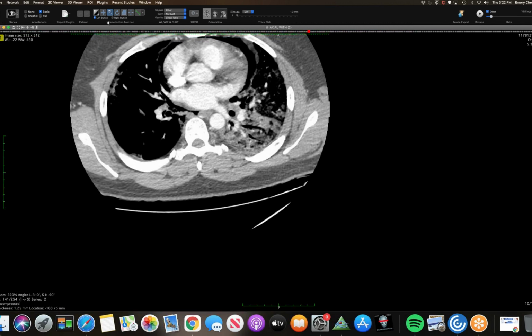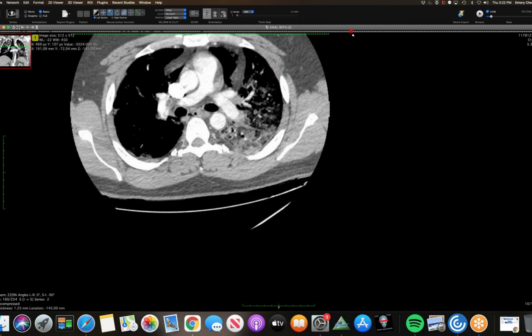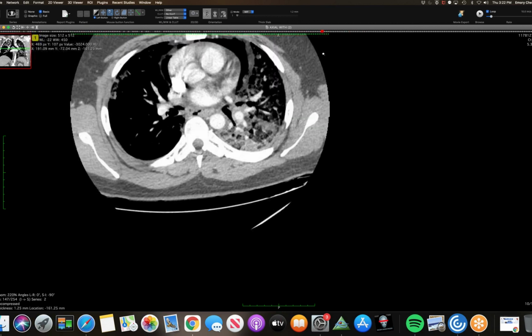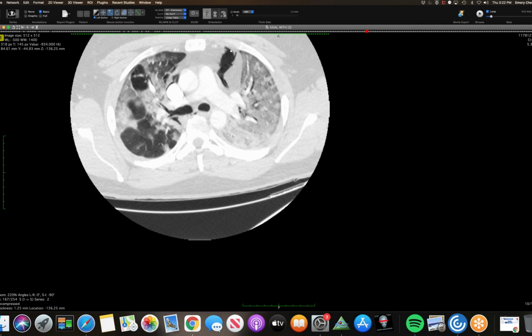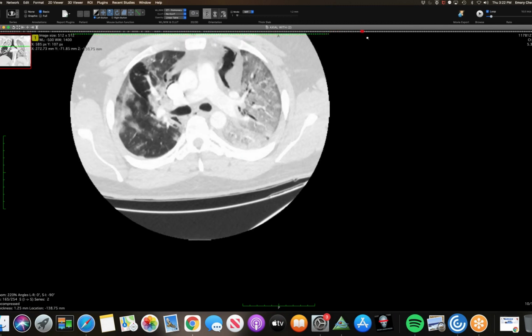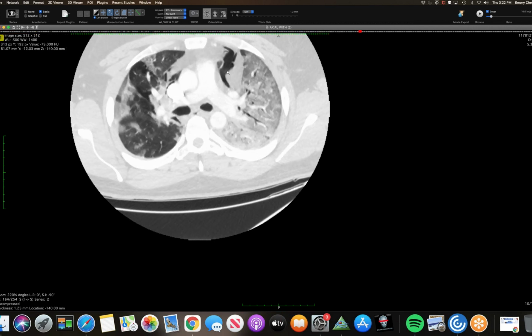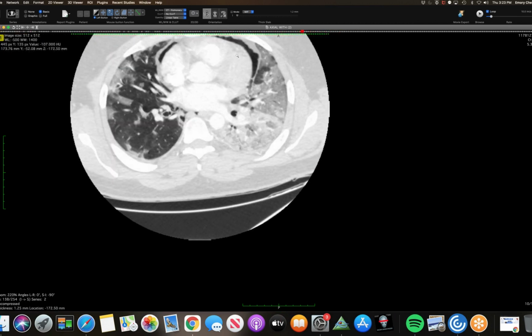And so all it has to do is track up those pulmonary veins, and it can go all the way back into the pericardium. Yeah, but this doesn't really make sense then, right? This lucency here is going anterior? Yeah, so it's beyond the pericardium, but there is a pneumopericardium component. And then there are probably little strands here which we can't see, but it definitely follows pericardial contours here.